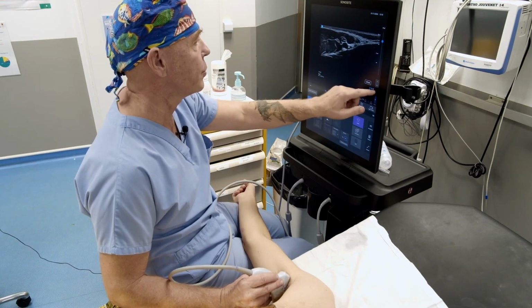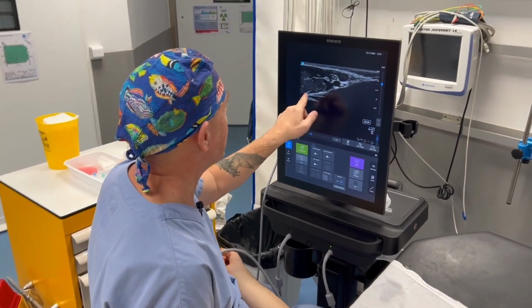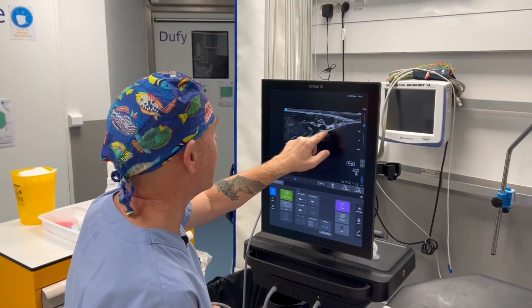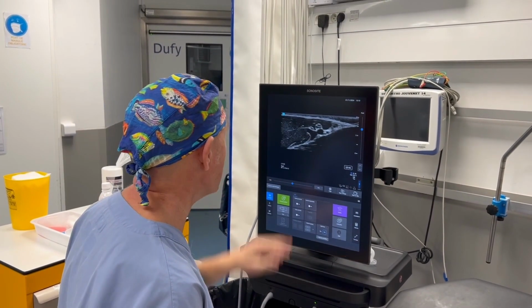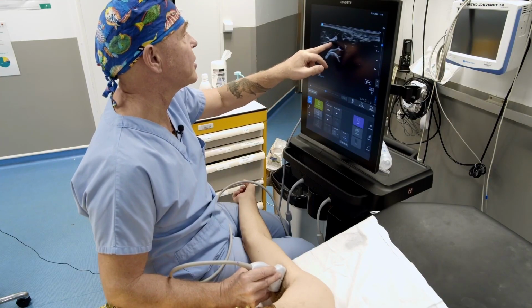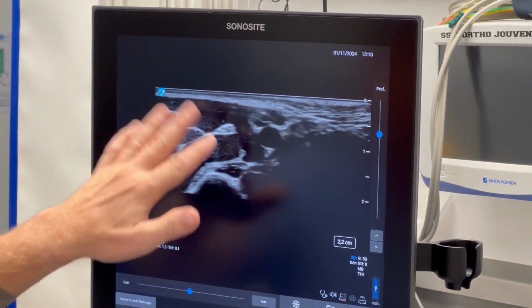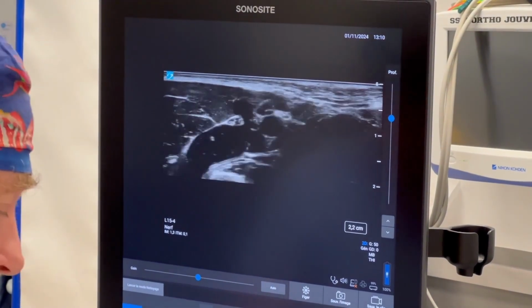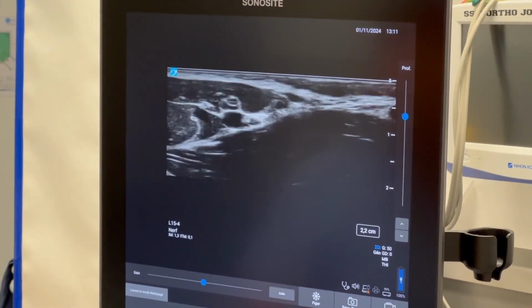So you see the main landmarks we saw earlier, namely the bone and the skin. The tendon of the latissimus dorsi, so as I was saying, to put things into perspective, the radial nerve, which is always located above at this level, and then the musculocutaneous nerve. Now you can see that the more characteristic image would be to have the musculocutaneous nerve between the biceps and the coracobrachialis. Well, this is part of anatomical variations. In a significant number of cases, as you can see, it gets closer to the median nerve.